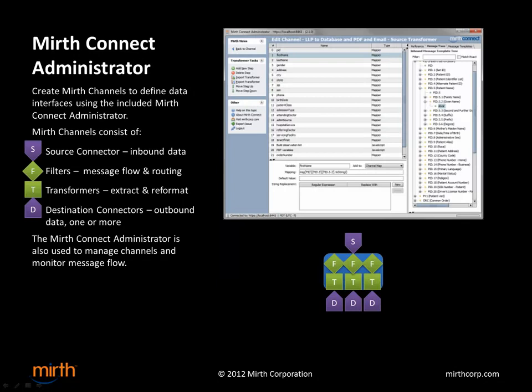So that was covering the Mirth Connect server, and now I wanted to cover exactly what the Mirth Connect administrator is. So the Mirth Connect administrator is a fat client for connecting to the Mirth Connect server and configuring your channels and overall server configuration options for the Mirth Connect server that's running.